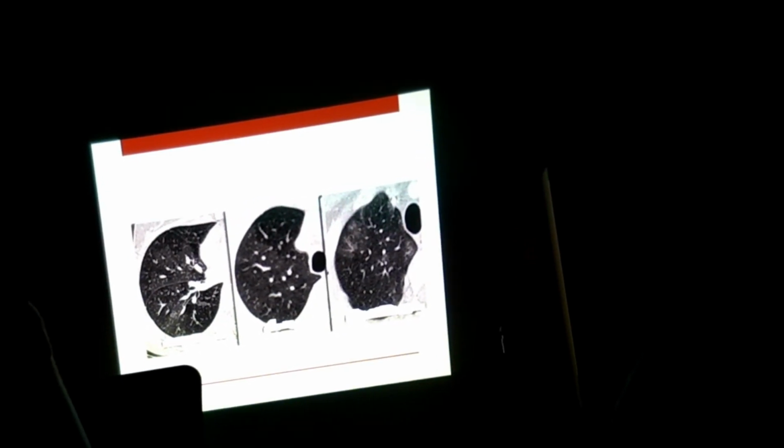If the vessels are the same in the black lung and white lung, then you are looking at a patient with infiltrative lung disease, like the one on the right, like I showed you. Thus, you see that there are vessels present in the white lung and in the black lung. This is a feature suggestive of diffuse alveolar hemorrhage.